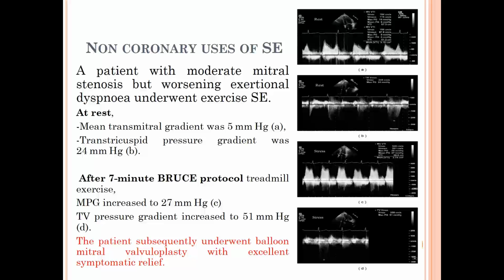And the tricuspid valve pressure gradient increased to 51 mm mercury. This means it was a significant mitral stenosis. So the patient underwent balloon mitral valvuloplasty with excellent symptomatic relief.